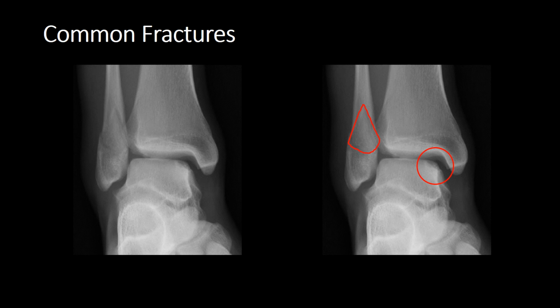So how do you differentiate between an osteochondral fracture and this appearance, which is described as Osteochondritis Dissecans? So with Osteochondritis Dissecans, you don't actually get a break in the cortex. If you look carefully, your cortex is intact. And then what you get is this reactive sclerosis adjacent to the subarticular lucency. Can you see how this is quite white here in comparison to the adjacent bone? And that means that you have reactive sclerosis to this previous injury.